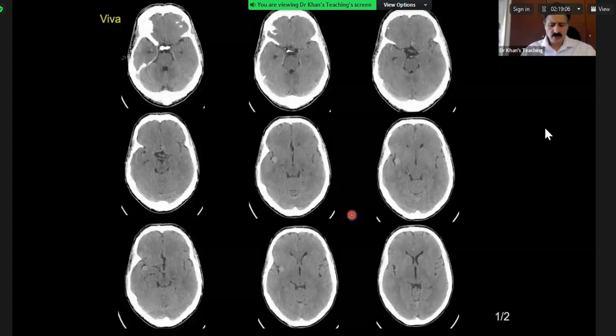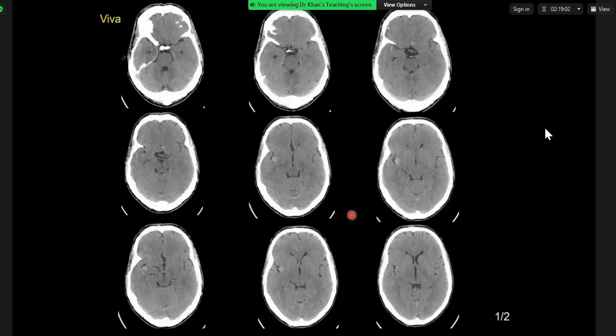Yes, please. So these are selected CT axial slices of brain, which is demonstrating a hyperdense focus on the left side near the origin of anterior cerebral artery. I'm just looking at the rest of it. There's also another hyperdense focus at the bifurcation, where the MCA would bifurcate or trifurcate. So there are two hyperdense foci. These are hyperdense on non-enhanced sequences. So these could well represent aneurysms.